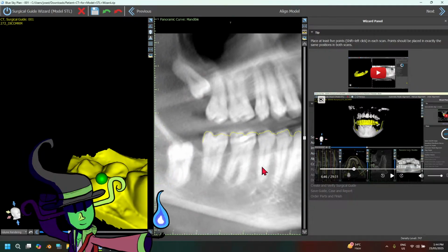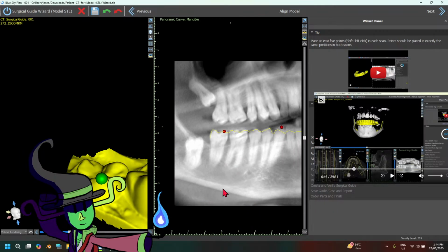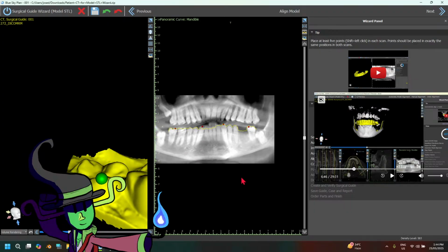By the way, if you guys are going to be using these softwares, I think it is best to have a mouse with you, because if you're using the touchpad of your laptop, you're not going to have a middle click to work with. I think most of these softwares do require you to have a middle click. Just like in Blender, you do need a mouse.